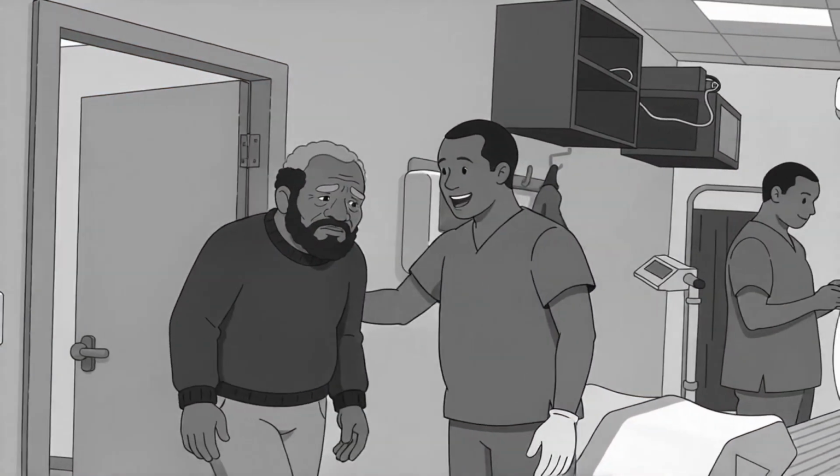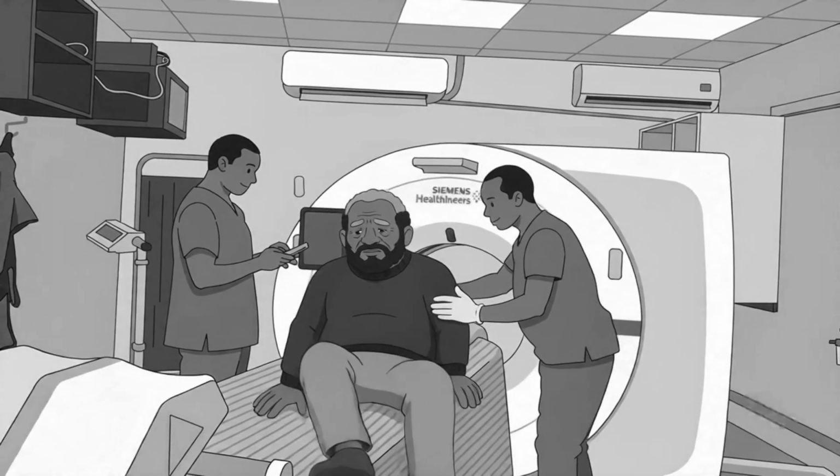Each one has a strength and each one has a weakness. But broadly speaking, a CT scan uses X-ray and is usually quick, less than a minute. Within seconds, the examination is over. But on the MRI, on the other side, it may take a bit of time. It could take about 30 to 45 minutes, depending on how many sequences you are running, and also on the strength of the magnet. So you can imagine if a patient is very sick and has to stay still, because once the patient moves, we may not get the image.